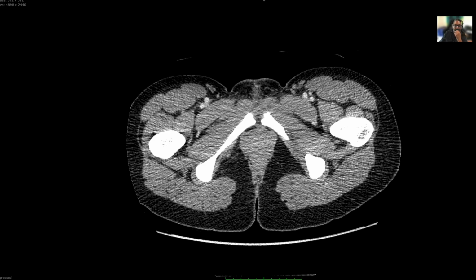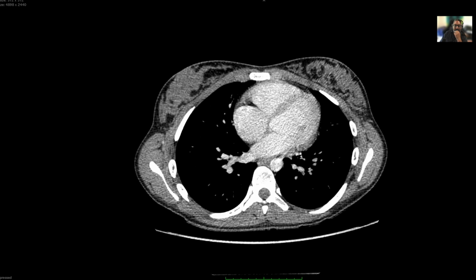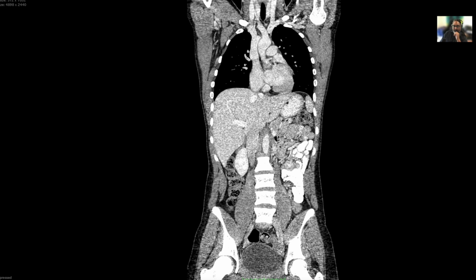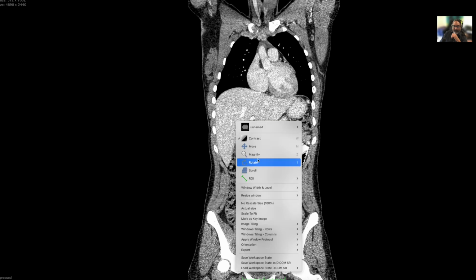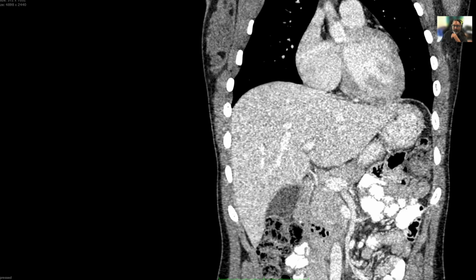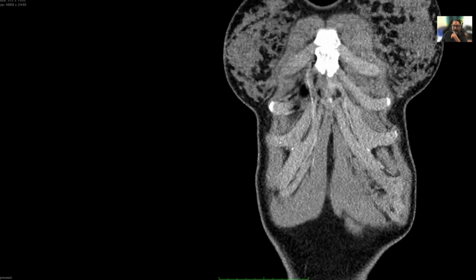So I do want to say that yes, the diaphragm and liver are very close by, except when you look at it in this view. In this view, it's a bit hard to see. You see how thin the diaphragm is. Even here it's a bit hard to see. Maybe if we magnify it, we'll see a bit of a difference. You shouldn't magnify it too much. But again, it's very hard to see any difference between the diaphragm and the liver.